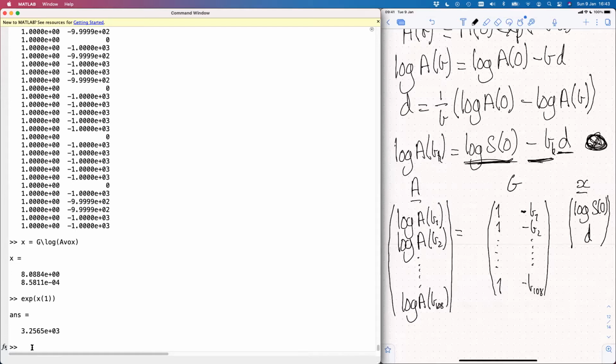How do we do it for the whole image? Well, we simply now just have to loop over the whole image and perform this same operation for every voxel of the image. So let's do that. I'll distinguish it from the previous one, which we called DMAP72, so I'll call it DMAP72-2.